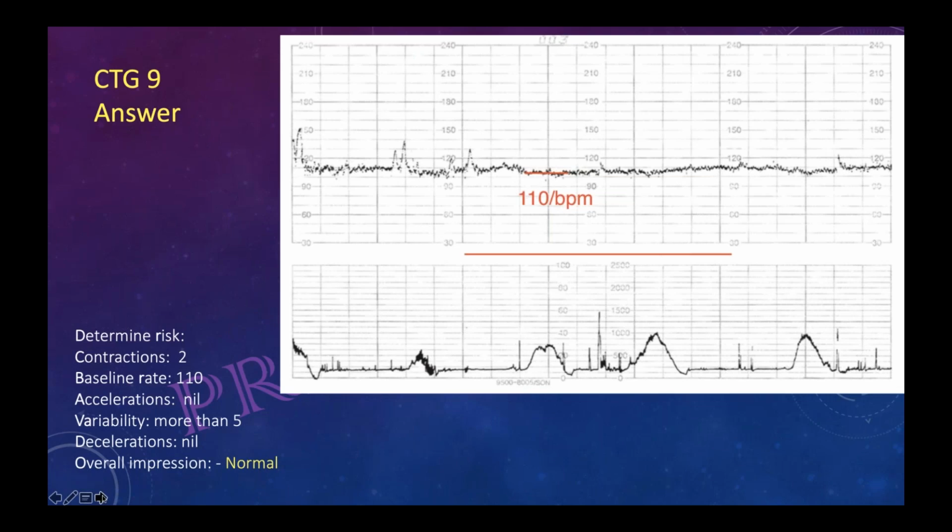Actually, it was looking like reduced variability to me, though not for more than 50 minutes. Okay, for variability, take this part where there is no contraction.